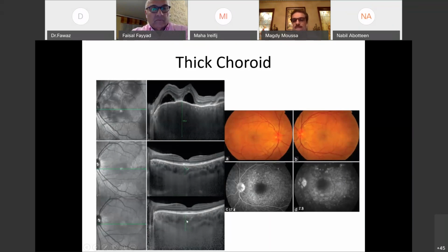So the swept-source OCT is a very useful tool for monitoring the patient with choroiditis, because even with the recurrence, we may look at the surface of the macula and find there is nothing, but actually there is something going on deeply. That's why the ordinary spectral domain OCT is just looking at the tip of the iceberg. So this is one of the advantages of imaging the choroid in choroidal disease.